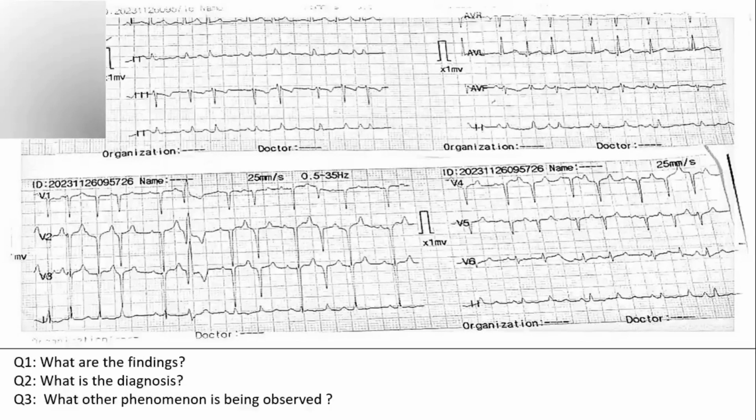But this looks more like an atrial tachycardia, because you don't see such types of AVNRT as a routine. For an AVNRT, they will give you a proper one-to-one tachycardia. Try to give the answer that looks more common. So this was an atrial tachycardia. Obviously, you have to write the P waves, the rate of the P waves, and variable, functional conduction blocks. So the question was, you said it rightly, Ashman phenomenon, but the other differential will be a PVC, right?